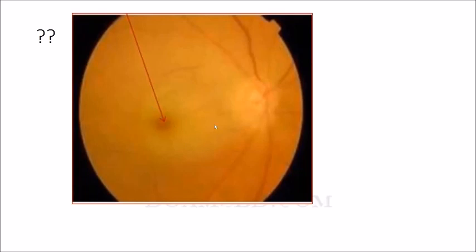The area name is the macula, but what is the red spot? The macula is actually a black spot, rather to say. The macular area is less vascular in the normal fundus, but the fundus is relatively white, pale. So the vessels are appearing red really. This is called cherry red spot. Cherry red spot, yes, sir. Right, Dr. Farial? You know it. Yes, I forgot, sir.